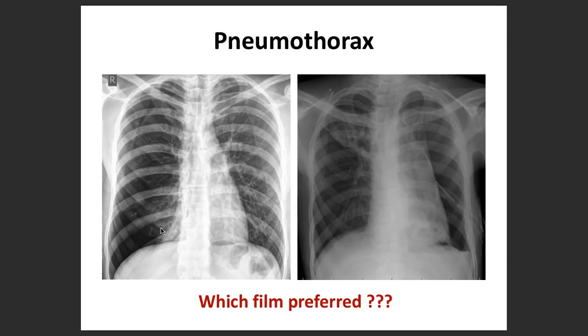So what is this one? I have already given the diagnosis: pneumothorax. Why is it pneumothorax? Now the question comes: why is it pneumothorax?